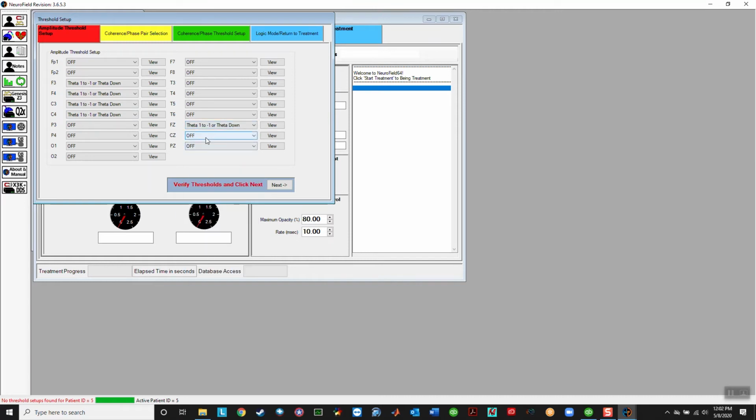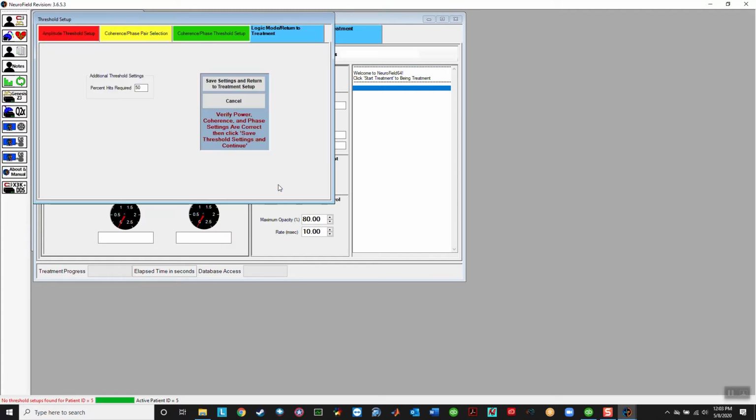Of course, you'd want your decisions to be driven by QEEG analysis. It will help you to make better choices as to what to train and where. So now, hypothetically, we're just setting this up. Once you have these sites set up, you click on Next.